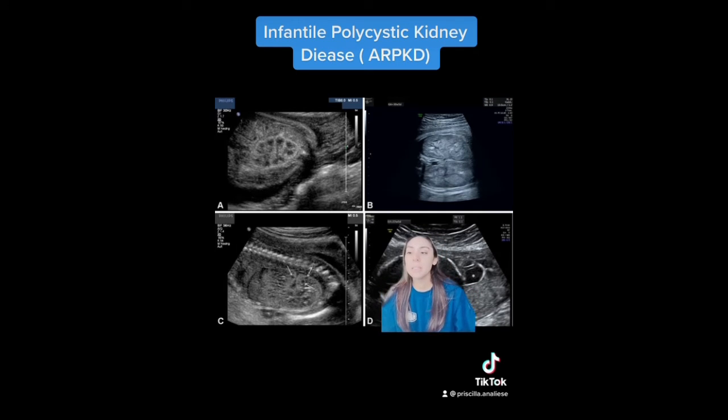As far as the kidney cysts go, they are caused by tubular malformation and ectasia, which basically means dilation of the collecting ducts, and usually it is the distal collecting ducts. So with ARPKD, it does result in cystic dilation of the renal tubules arranged in a symmetric pattern. As you can see in these ultrasound images, the kidneys are just really enlarged, so that's what it leads to.